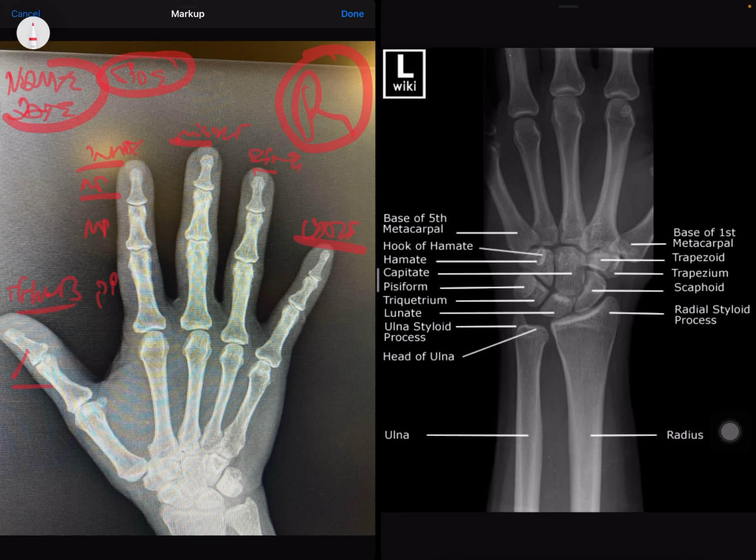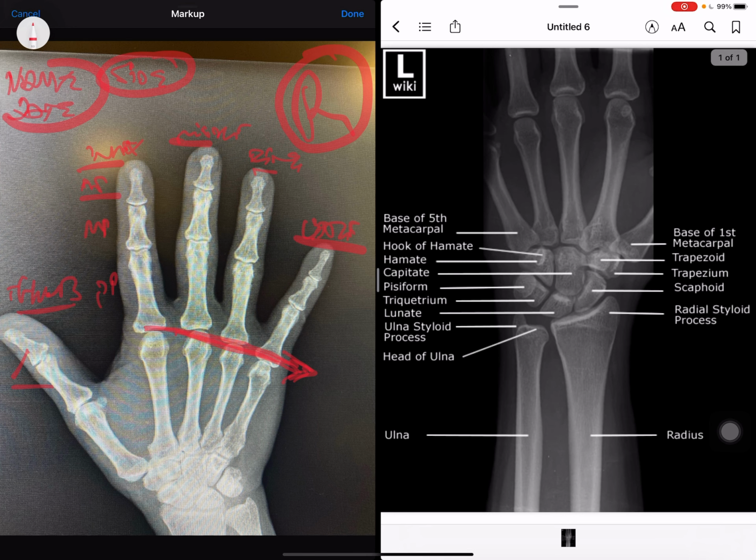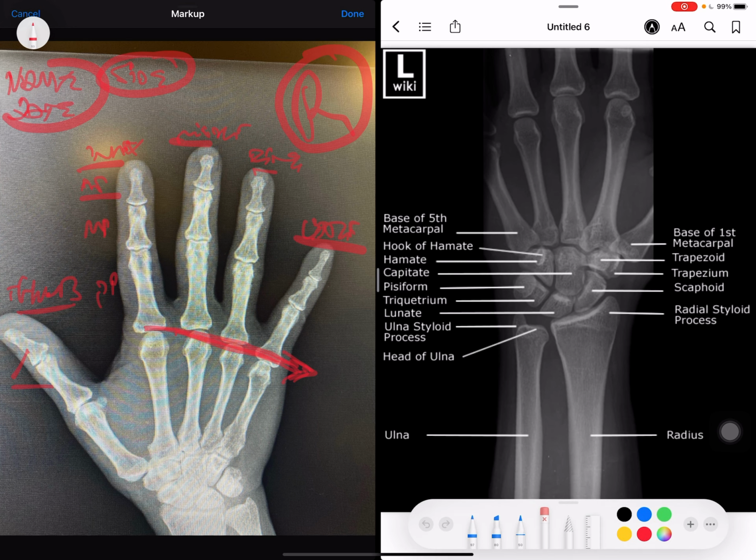decreasing size. Actually, it's very interesting if you follow the lengths of the metacarpals for the hand as you go from the index to the little finger. It's a slope actually, like a nice gentle slope. And this is important. If you have a fracture, this slope is adjusted. It'll be shortened, and then you see a defect. We try to get the slope back. Everything in human anatomy has a sort of a nice curve. If you follow the normal side too here, there's a pen here. You have a curve.